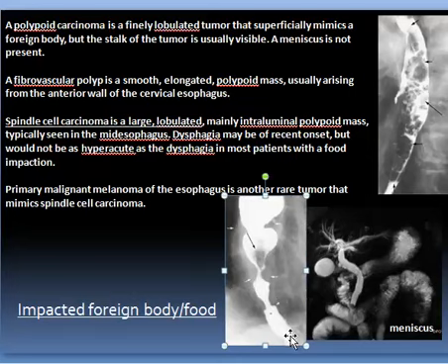At the same time, there is part of the stomach above the diaphragm, denoting herniation. Don't forget that a foreign body, a stone, can give rise to a meniscus sign as here, and not all interruptions are due to carcinoma. So this one is due to a stone, and it has a convex upper margin called the meniscus.